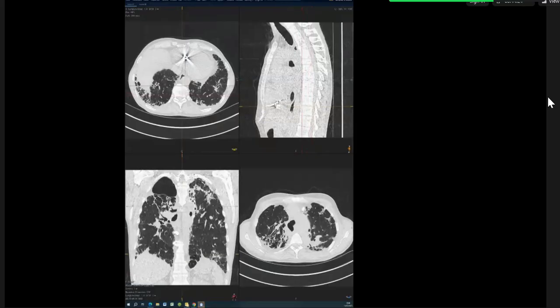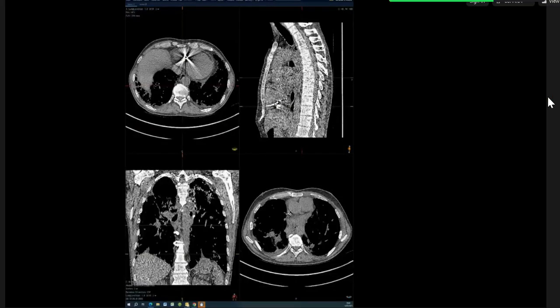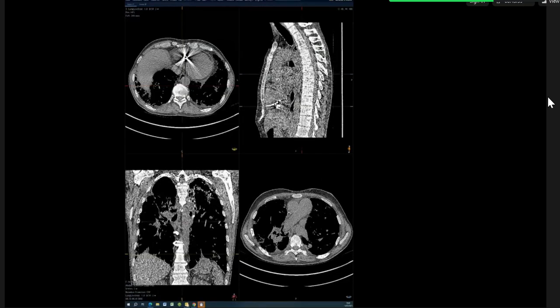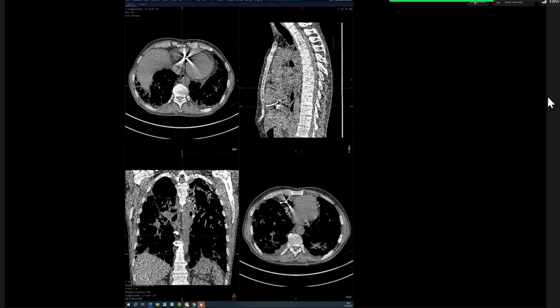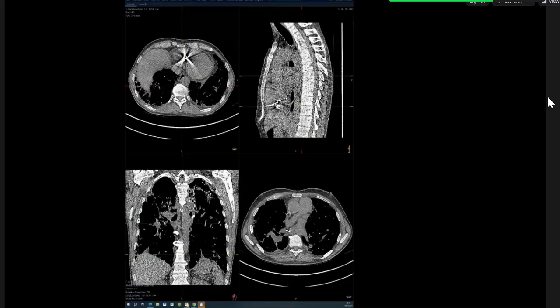Is there something specific about the pattern of fibrosis? Is it more anteriorly or more posteriorly? It's more posteriorly. Do you know which disease does that? Not sure. Okay. Do you want to look at the lymph nodes? I would like to look at the abdominal window, soft tissue window. There are not many, but a few calcified lymph nodes. No significant lymph nodes.